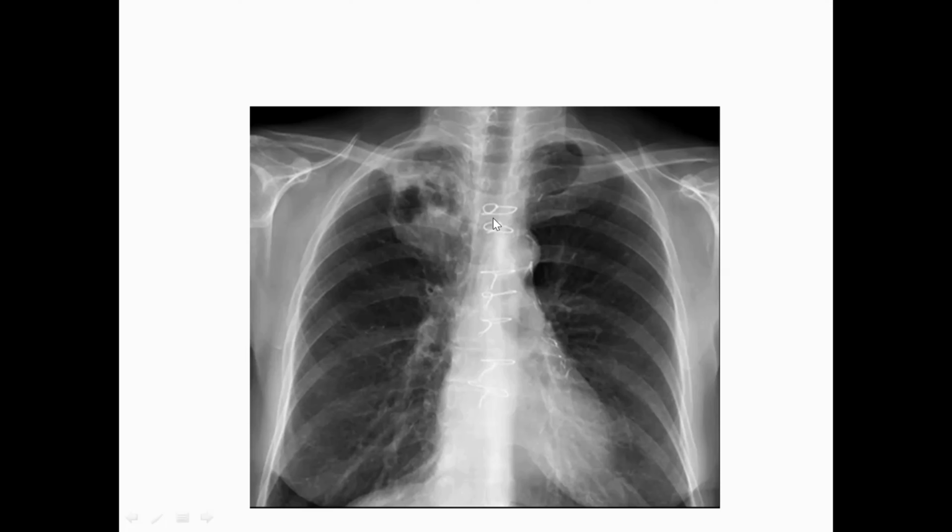Then say, is there any other consolidation? No. Why do you have to comment? Suppose in the hilar region, is there any lymph node, anything dense, bulky? No, I can't pick any density. If you compare, the patient is a bit rotated to the left side, that's why in the right hilum you see a bit denser, but otherwise the density of both hila, or bulk, is nothing. The same density, same bulkiness, same level.